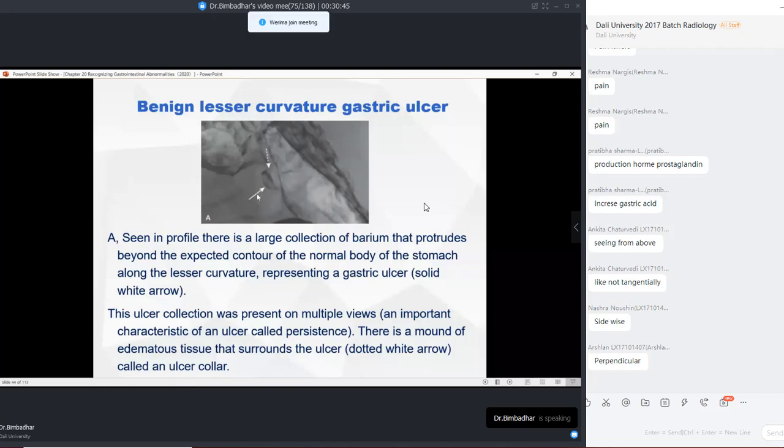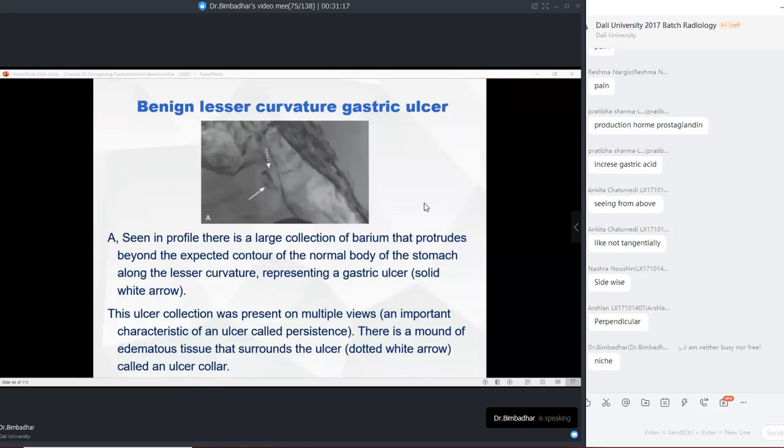Very simple one. The first thing we know is that a gastric ulcer is a mucosal erosion. Mucosal erosion causes a depression in the gastric mucosa. Depressions in the gastric mucosa are liable to collect the barium contrast material. When the barium contrast material collects, it forms an area which is called a niche. Remember, it collects in an area called a niche. A niche is a specific area that looks prominent, it has to look white.